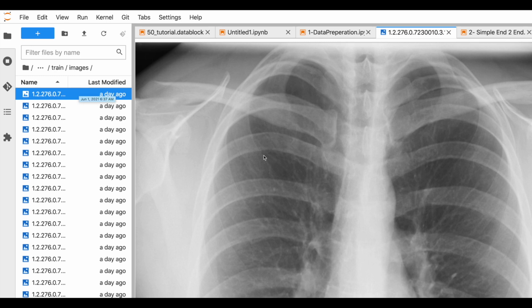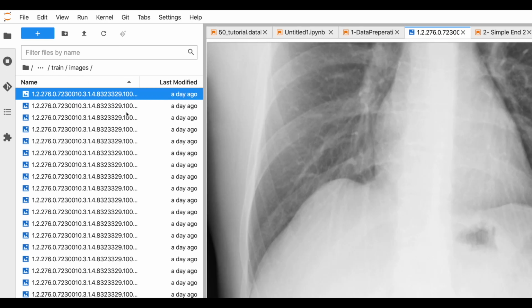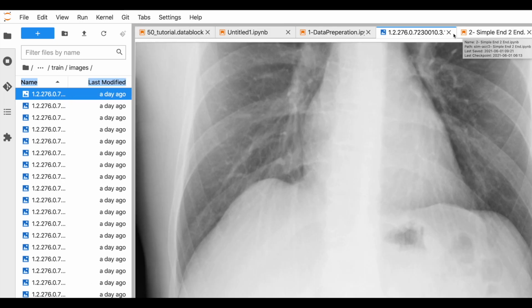So it's generally a good idea not to open a folder with a huge number of images. As you can see here, from the custom DICOM format, we just changed it to a format, probably PNG or JPEG, I'm not sure. Let me pull this here. Oh, that also doesn't work. Everything works, but it's going to take its own sweet time. So let's just close this. It's a PNG format.